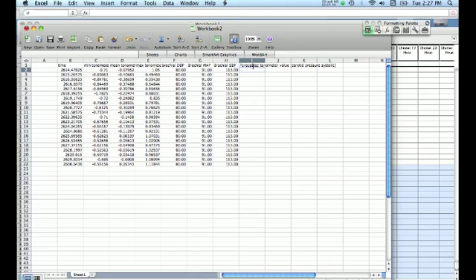To determine this particular value, we use a function which basically determines the linear relationship between these two values and these two values. So you plot, essentially, this and this versus this and this.